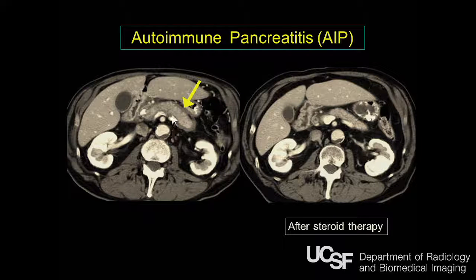Here's a case just to show you there's mild enlargement of the gland maybe, and then this rim of low density. Well, after 8 weeks of steroid therapy, you can see there's complete resolution of that rim, and the gland has significantly decreased in size.